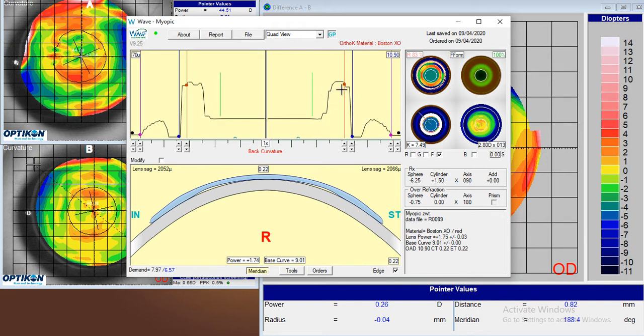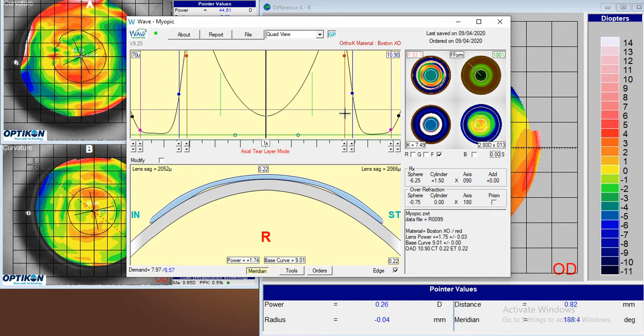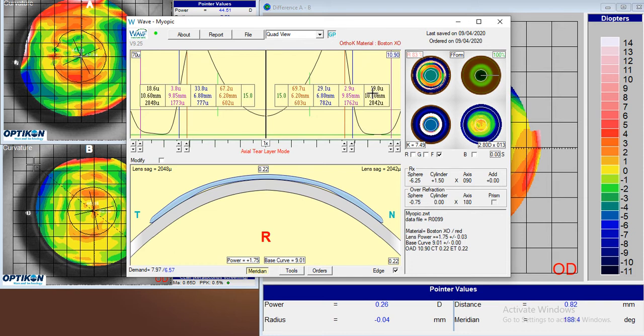So for example here, if we were to use this meridian as our starting point, which is here, then those numbers will match up. That's something that generally happens only here at the blue control point where the reverse curve is, but it will still give us pretty much the same results. If we look at the pink control point, we're now at 1762.